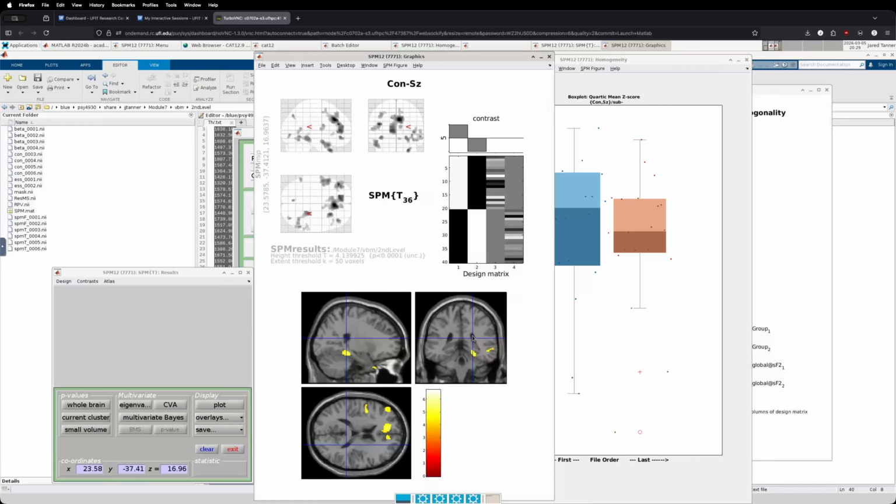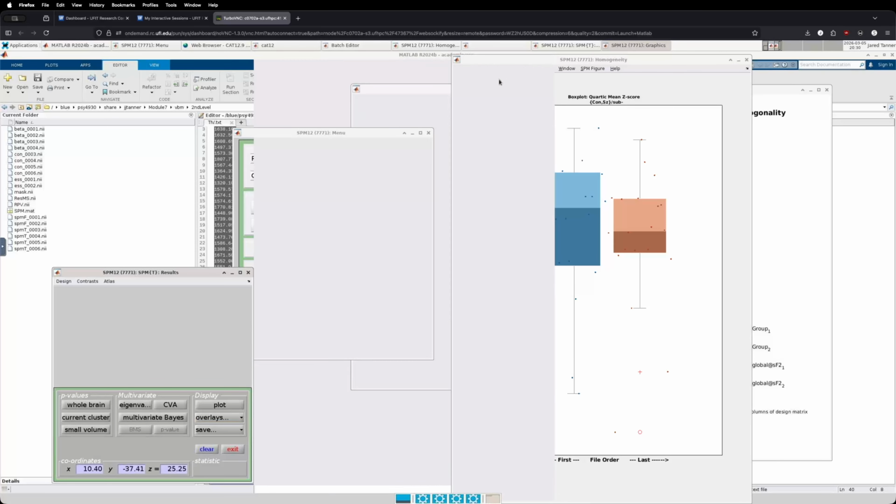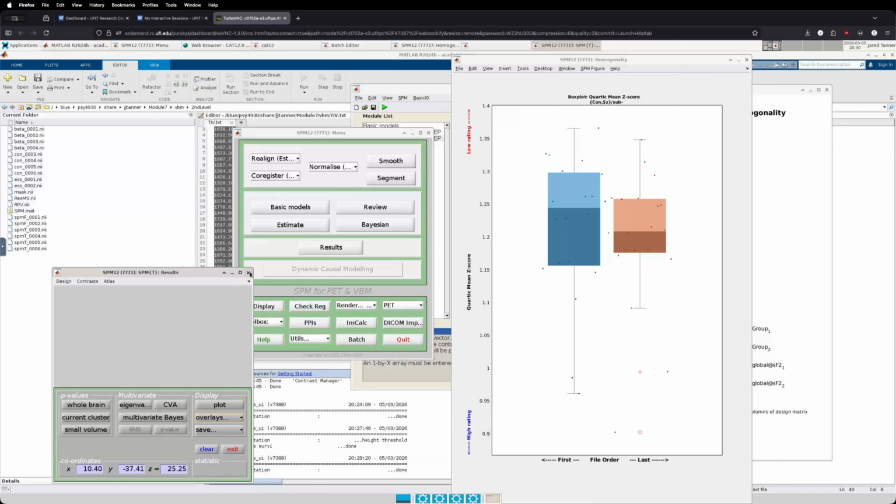And so the question is, well, do these relate with behavior? And so those can be some of the next analyses that you might do with a research study. But again, this will just show if there's some differences. Now, these data have been published already. These are publicly available, meaning these analyses have been done. But I mean, this isn't particularly new data, but if you were doing this with a novel data set, you could see some findings and publish this.